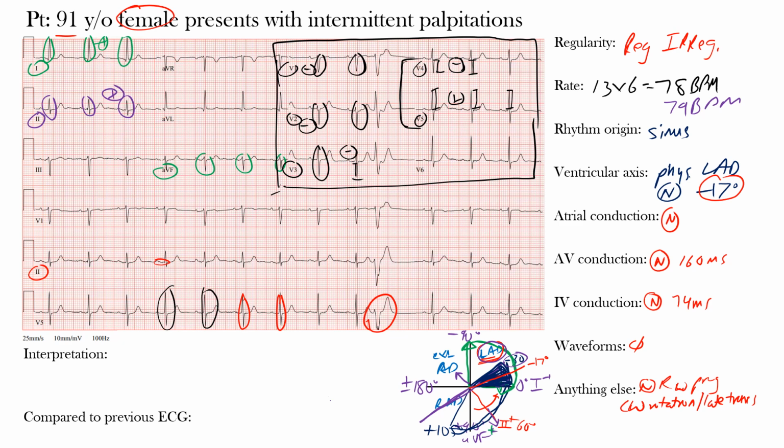However, if you're originating from within the ventricles, as we see in these complexes here, now you are outside and you're taking those back roads to the ventricles to depolarize them and originating from within them, so it's going to take much longer to depolarize all of the ventricles, and therefore you have these wide ventricular complexes that result. So we're outside of our normal conduction system, originating from somewhere within our ventricles.